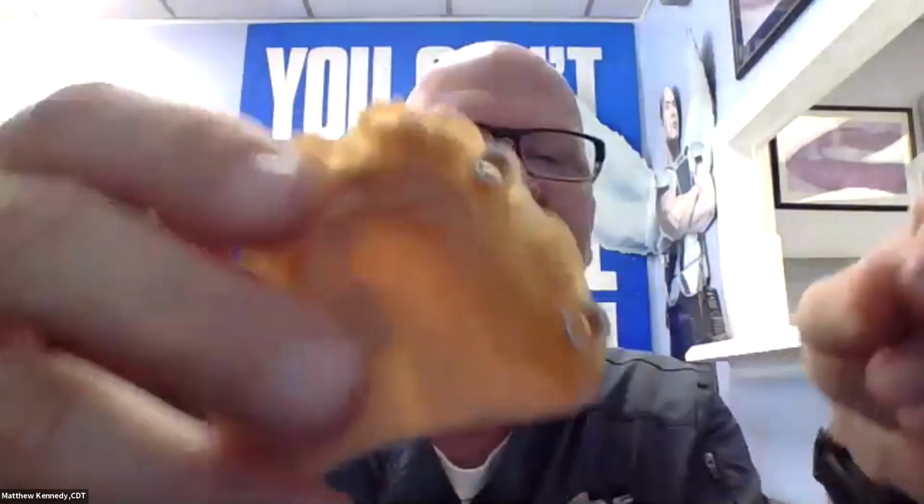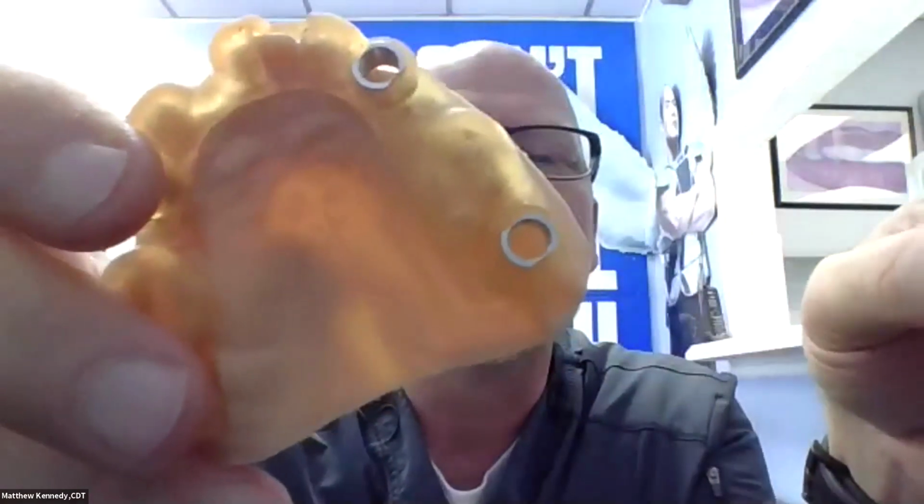The surgical guide. Adrienne, I agree with you. When we do our surgical guides, we always put our sleeves in before they're cured. It makes for a much better fit and less adjustments, and your surgical guide fit your model absolutely perfect, and very nice. Very impressed with the print.